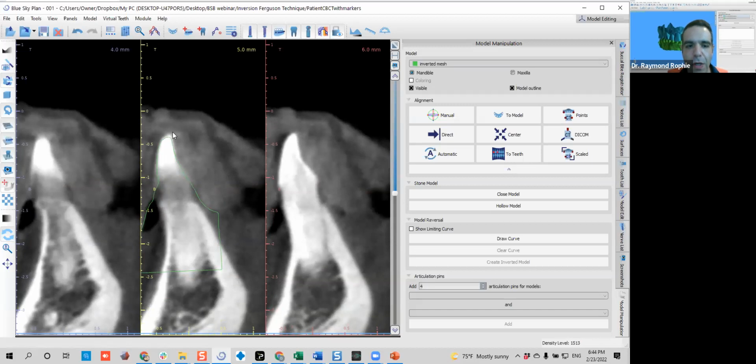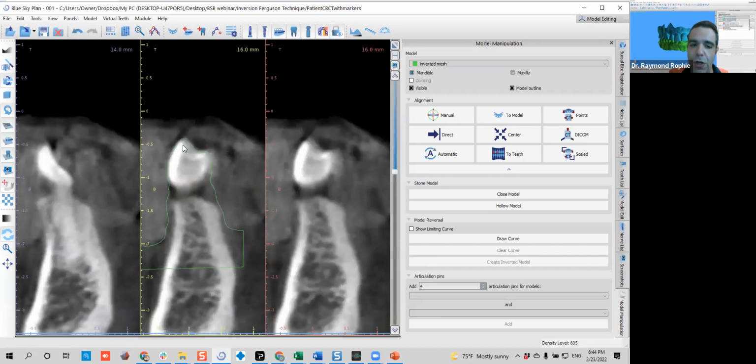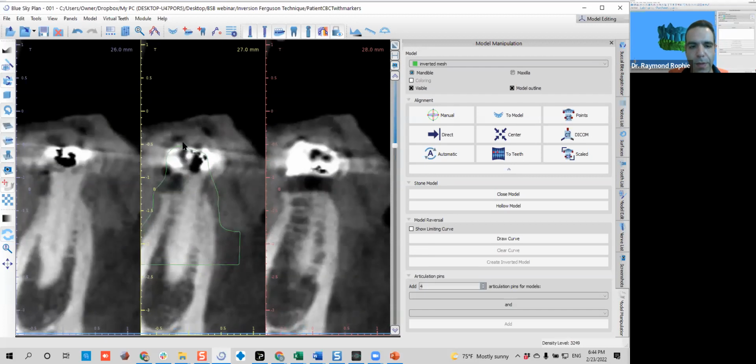Again, we have that same constant that all my model has this incisal and occlusal area that is just a bit lower than the tip. It can be because as well the CBCT cannot take those sharp edges. Okay, so don't be that hard on yourself or on the equipment.